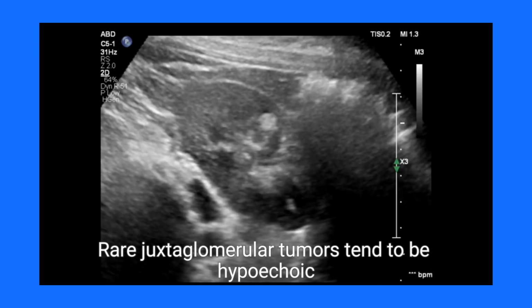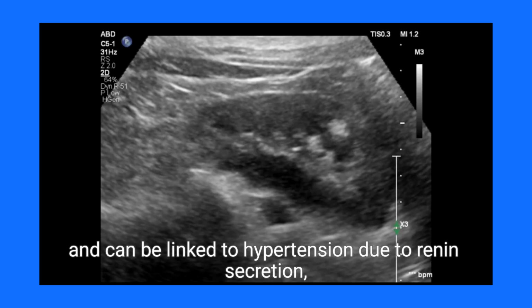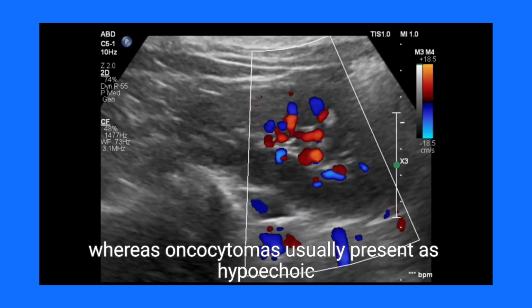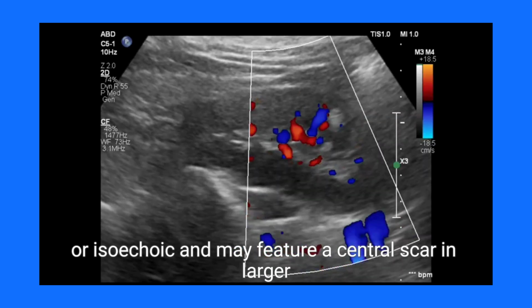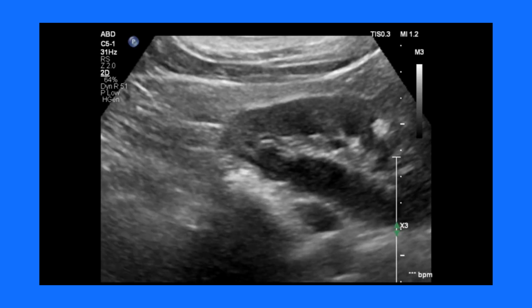Rare juxtaglomerular tumors tend to be hypoechoic and can be linked to hypertension due to renin secretion, whereas oncocytomas usually present as hypoechoic or isoechoic and may feature a central scar in larger manifestations.